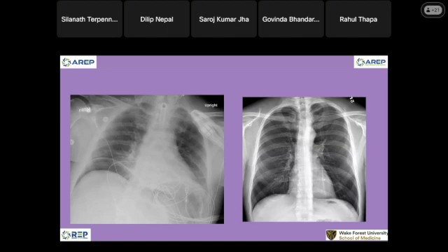What do we see here? We don't see the left lung. Let's look at the airway. This is our trachea, maybe. This is our carina. Lateral sulcus. We're going to focus on the left lung. The costophrenic sulcus here is still okay, maybe a little bit on the left. The left main bronchus is cut off, and everything else is gone.